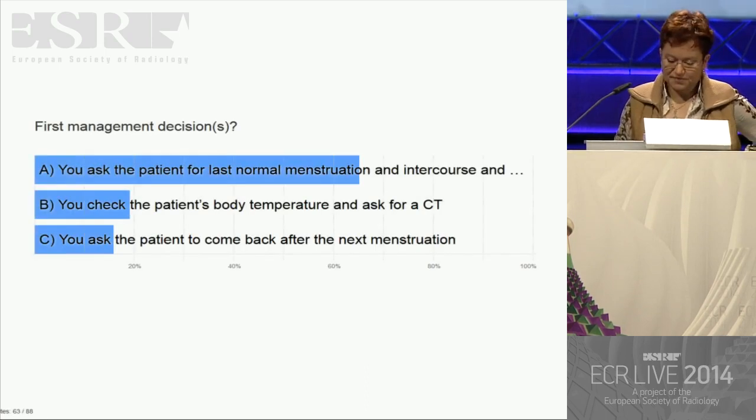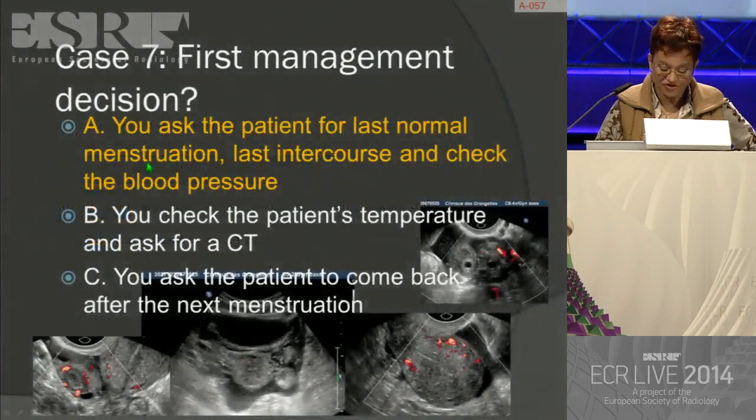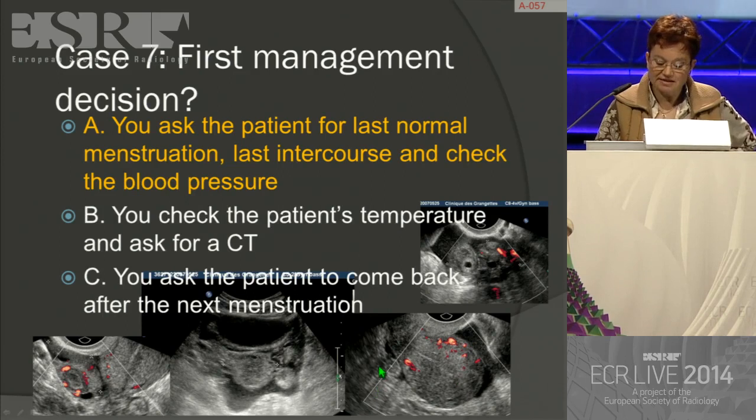Okay, very good. So let's go back. This is definitely a patient that needs to be checked for her blood pressure. You can see that she has a lot of blood or potentially pus inside her uterus. There's fluid around the uterus. The uterus is empty. She has irregular menstruation, so you cannot exclude extrauterine pregnancy. And this is actually what she had.